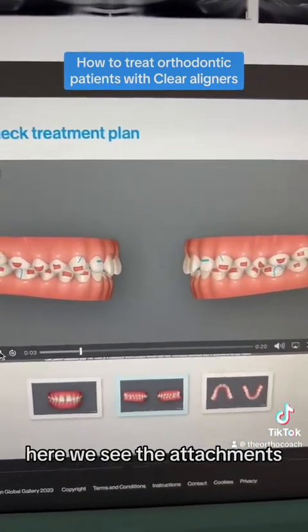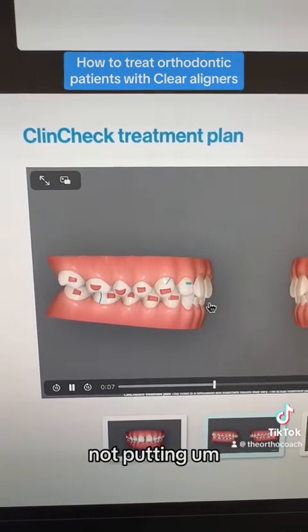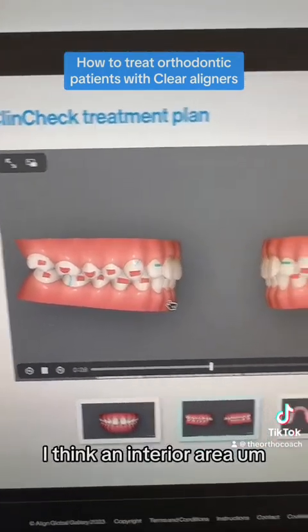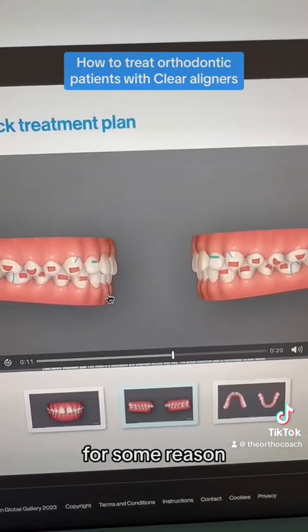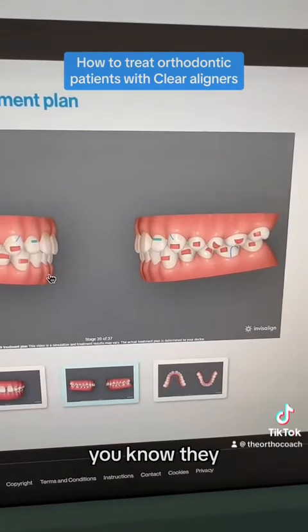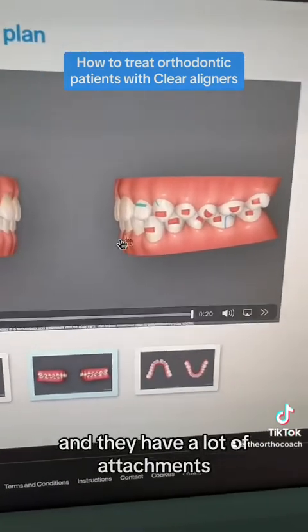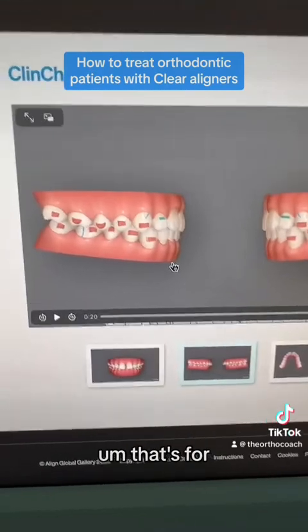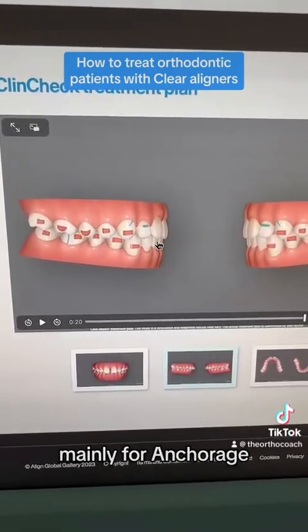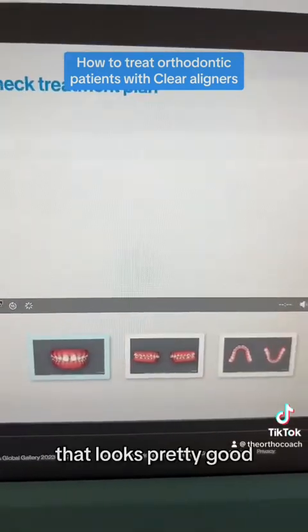Here we see the attachments, and they ended up not putting intrusion attachments, I think, on the anterior area for some reason, but I think I would add those, and you can tell that they're correcting the deep curve of Spee very nicely, and they have a lot of attachments even going back to the second molars. That's mainly for anchorage, so we can intrude the lower anterior teeth. So that looks pretty good.